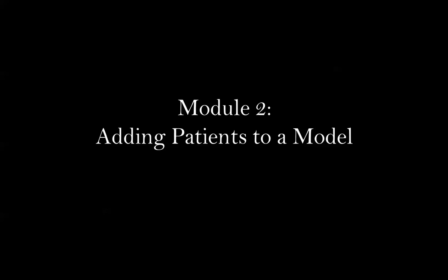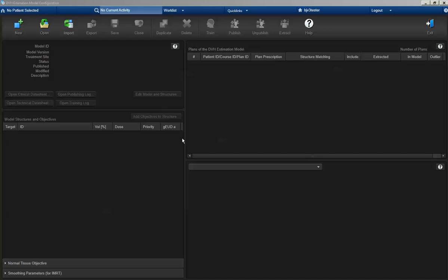In this module, we will discuss the steps taken to add training patients to a rapid plan model. Before adding patients to a model, it is necessary to create an empty model in the Model Configuration workspace. Select New in the upper left corner of the screen to create a new model.